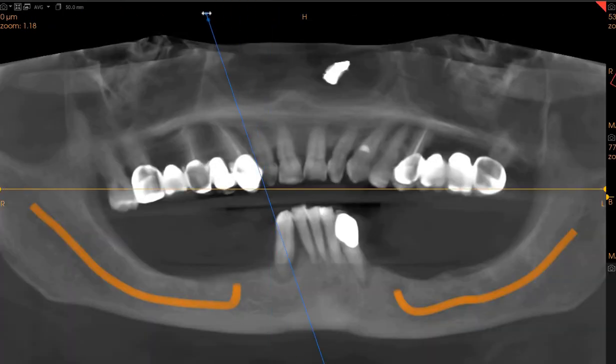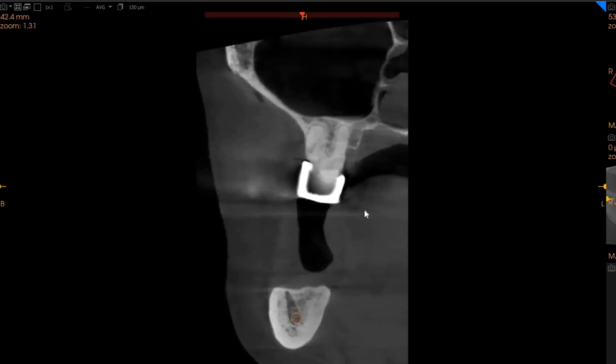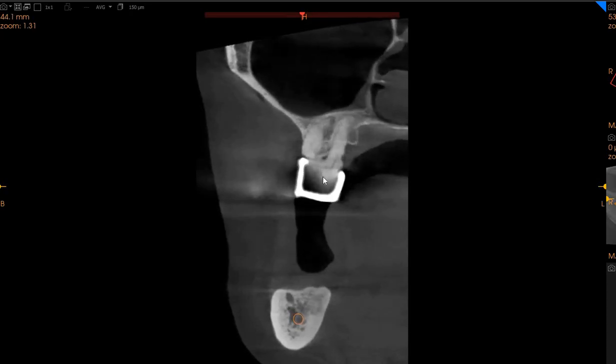Here is the CBCT of the patient that you had requested. The area of interest is all the areas where we have edentulous spaces. So if you look at the upper right bridge, starting with that, we've got furcation involvement with a little bit of a disto-buccal root involvement, no periapical radiolucencies in the upper right 7.